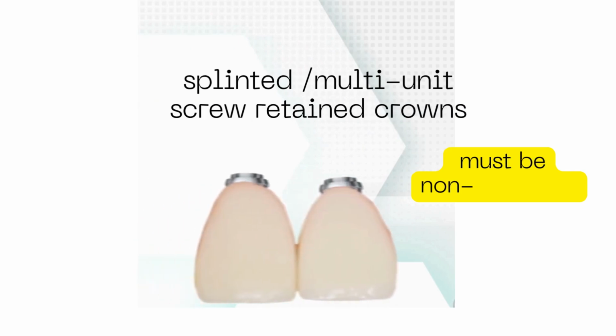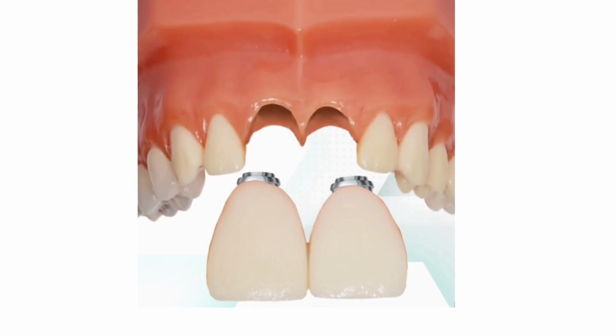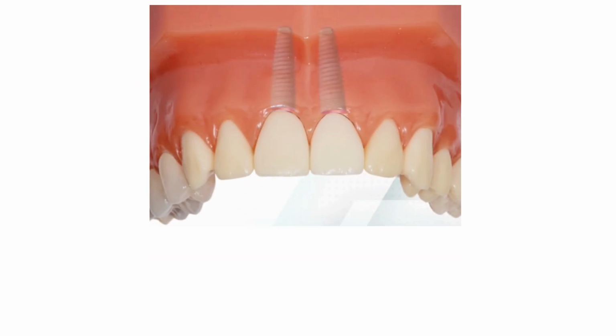When multiple screw-retained implants are splinted together in a bridge or full arch restoration, the prosthesis itself prevents rotation. So not only is the anti-rotational feature not needed, it will cause problems. If they are used, it would be nearly impossible to get a passive fit. If the implants aren't completely parallel, it may not even be possible to seat the bridge due to interferences.